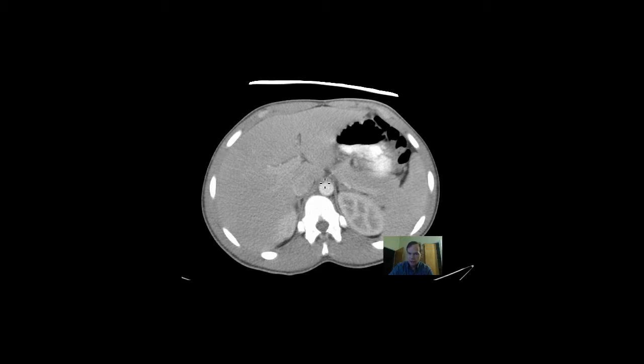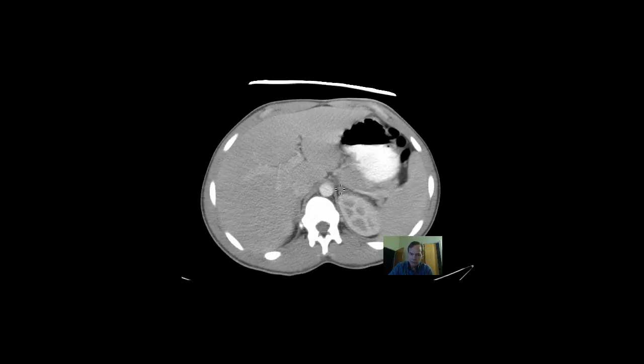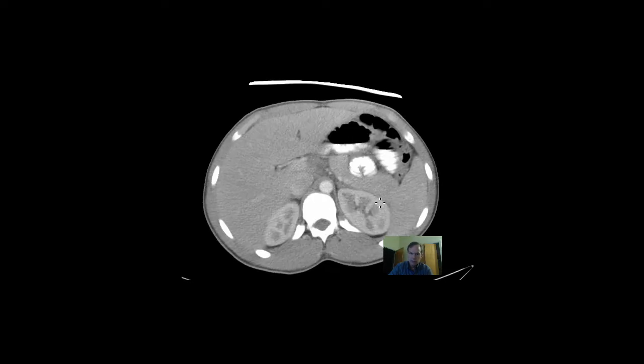these little lines right here are the adrenal gland on the right, and then on the left, this one has a little bit more substance to it right here. That's the left adrenal gland. They typically stand out quite a bit more because there's more fat separating the adrenal glands from the adjacent structures.